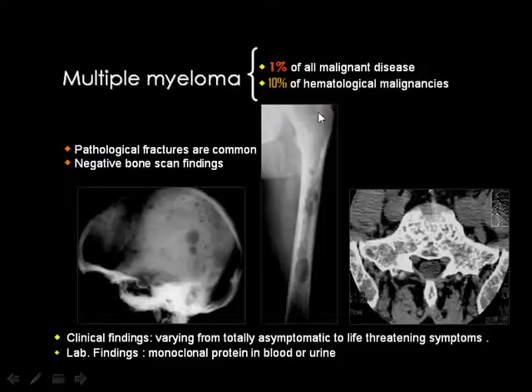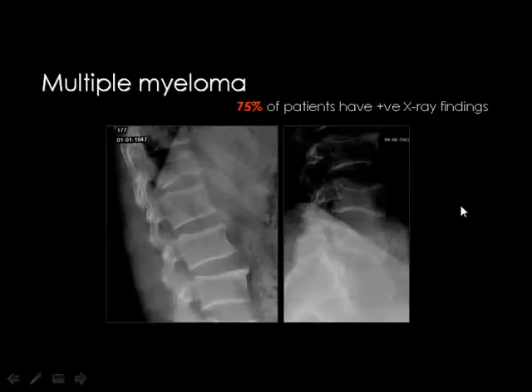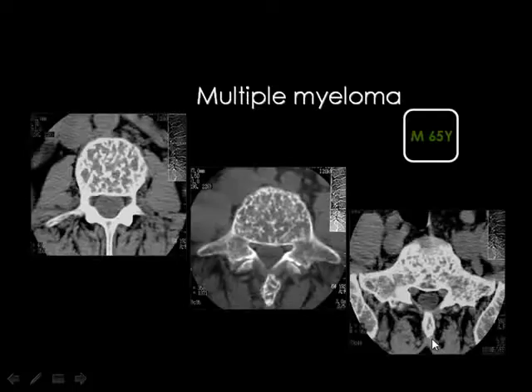The myeloma lesions are usually osteolytic. They give negative bone scan findings. They usually are of almost similar size to each other, and they are absolutely osteolytic. Then you can diagnose the lesions by the presence of characteristic proteins in urine, and you can see these lesions by CT or by MRI. In the plain X-ray, you can see osteopenia of the vertebral bodies and partial collapse of, like this one, you see a partial collapse of L5 and this D12 or L1 vertebral body as well.